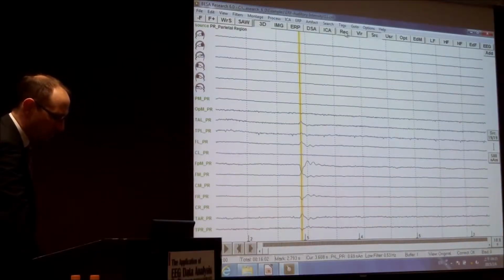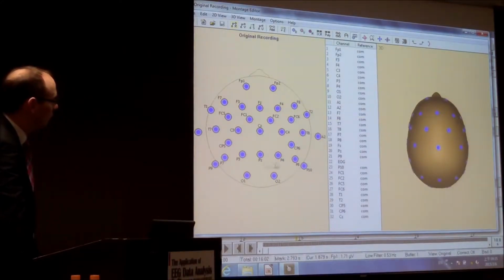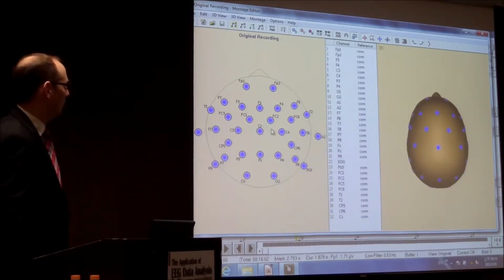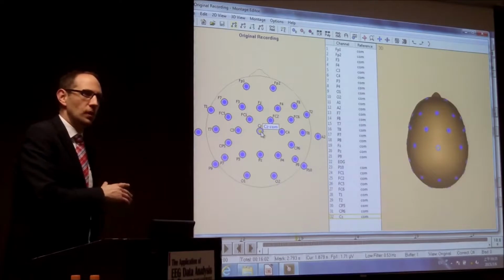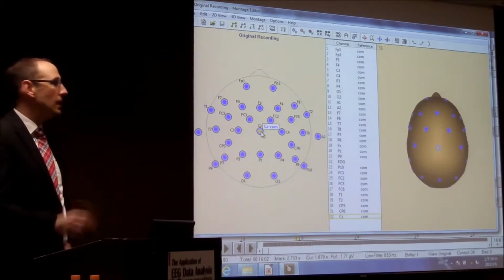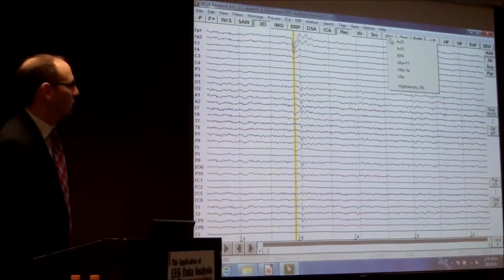In this montage editor, if I go to the recorded montage and go to the montage editor, you can see here the recorded montage. And suddenly you can go here, you see that the electrode is displayed on the other side with a yellow dot. And you can then here change the montage. You can have your own montages. You can have virtual montages. You can create your own source montages. And all of these montages you are doing will be under the user montages here.